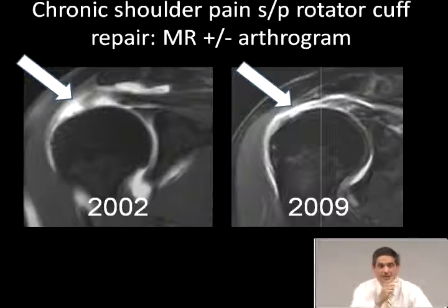You may have an injection of the glenohumeral joint going through the rotator cuff into the subacromial deltoid recess, or bursa. But any large gap in the repaired cuff is probably a failure of the repair. This 61-year-old had several years of pain relief after a repair, and then he had recurrence of symptoms. And you can see that he's had a repair, tear, re-tear.